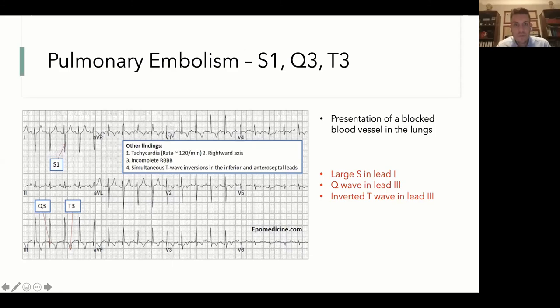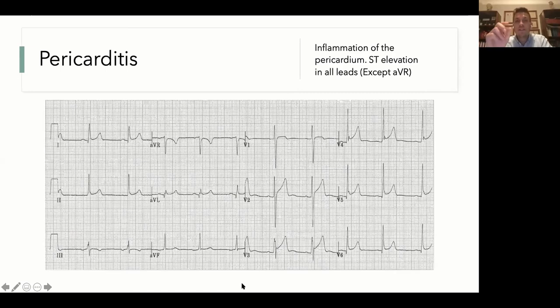Condition number 2 is pericarditis, and I hope you were following when I said that in STEMI, you need contralateral depression of the ST segment. And this is why, because here, if you except aVR, where it was correctly said that you can have negative waves, ST elevation can occur in every single other lead. And this is very important to make you think of pericarditis and not only STEMI. Okay, do you get this? Does everyone understand this? Philippa, is this okay as an idea?